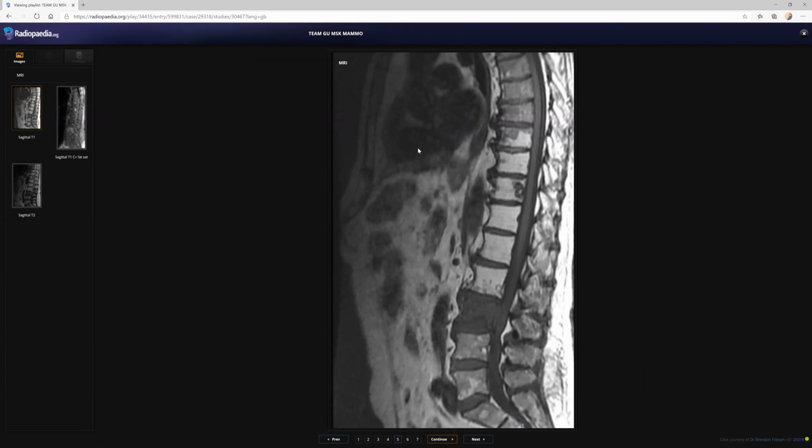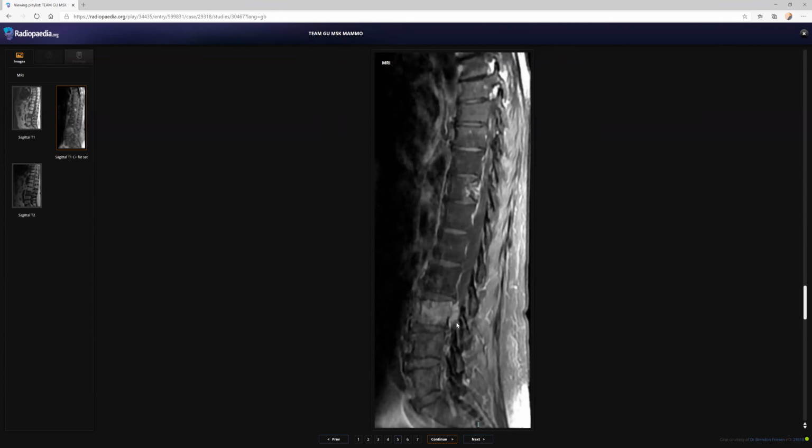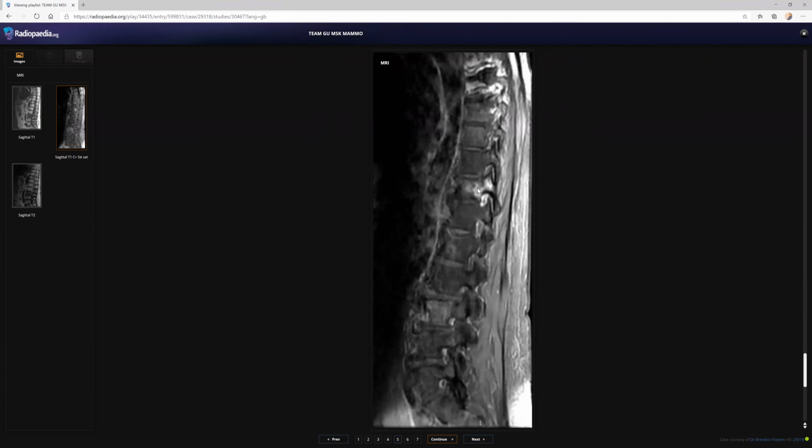And here actually in a nephrectomy case, this patient had radiation. So you can see the fatty replacement of the vertebral bodies due to radiation. Usually the iatrogenic causes will have sharp margins, like here only the areas which have got the radiation show the fatty replacement. And here you correctly pointed out the marrow replacement by the metastasis and the collapse of the inferior end plate, and you should have asked for the contrast. Then you can see the enhancing component that is projecting into the epidural space, and also the involvement of the T11 vertebra.